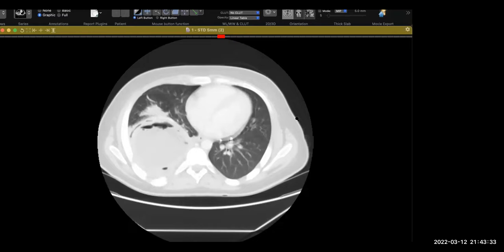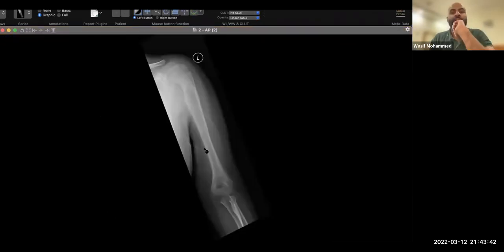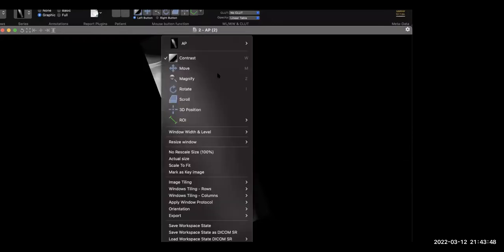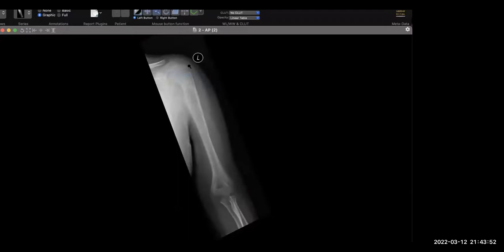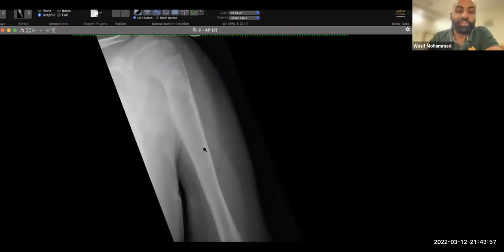All right. So let's just start the discussion. Your first case, there's a permeative bony lesion, right? In your description, you need to mention 6 or 7 things for any bony lesion. It should come instantaneously. So there is a wide zone of transition.